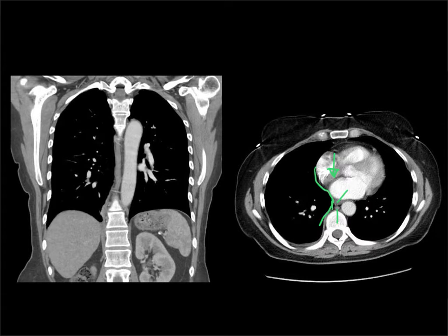So what is going to make that abnormal? Well, let's think about it. We've got the azygos vein there, we've got the esophagus that is going to lead down to the stomach. So if we rupture the esophagus, for example, with lots of blood, that's going to bulge it out here. If we had adenopathy in that area, it's going to produce a bulge out here. And then the esophagus is going to lead into the stomach. So probably the most common reason for a bulging at the azygoesophageal line is a hiatal hernia, because that hiatal hernia is going to come up into the mediastinum like this.